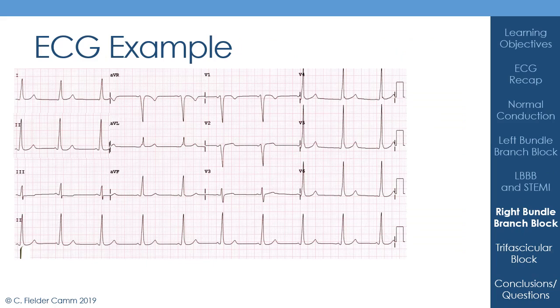Okay, so hopefully you've had a chance to interpret the ECG. Let's start at the top as usual. I don't have any details for you, so we can move on to the technical aspects, which show that this appears to be calibrated normally based on that rectangle on the right-hand side. The heart rate is probably ever so slightly slow. It's probably just over 5 large squares between each R wave, so it's just slightly under 60 beats a minute.